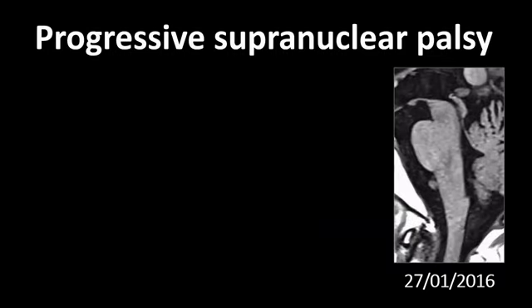It's also, in my opinion, one of the most overrated signs in neuroradiology and often incorrectly used because, to be honest, this could also look a bit like a penguin if you use your imagination, or if you just look at the morphology of the midbrain and the pons, despite the fact that in this case, no macroscopic midbrain atrophy is present.